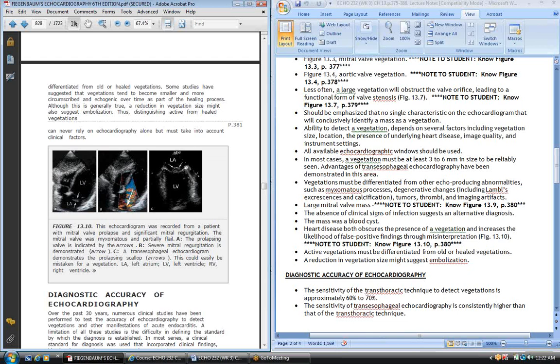It's because of severe prolapse and severe MR. But your job as an echocardiographer is to bring out the possible finding, a possible vegetation seen on the mitral valve leaflet. The doctor is the one that makes the final diagnosis. Of course, in this case, they did order a TEE apparently, and they were able to determine it was not a vegetation.